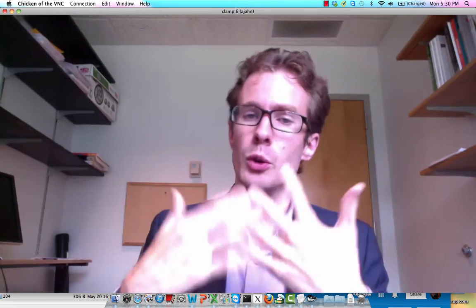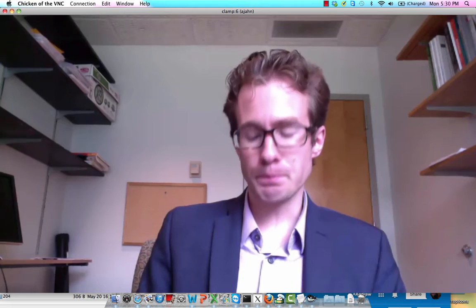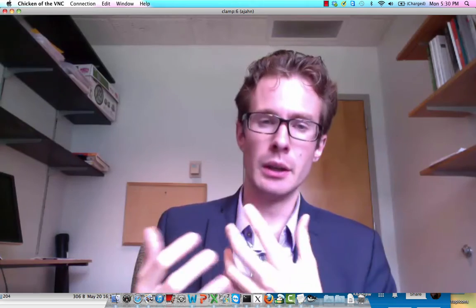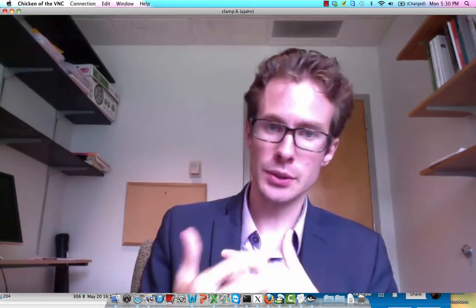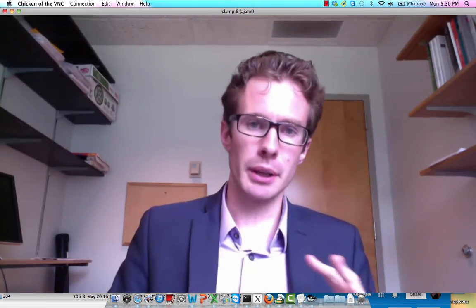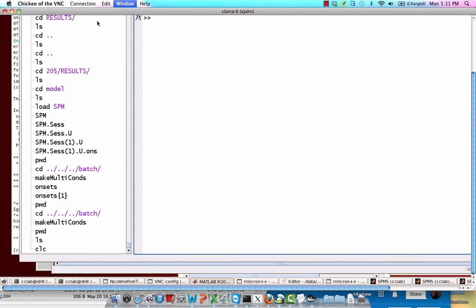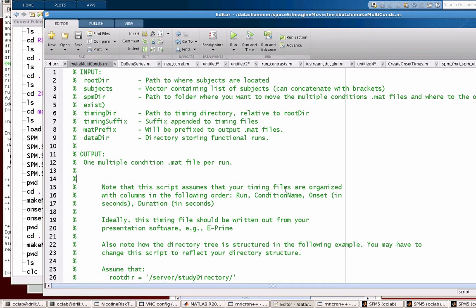I'll give a brief walkthrough about what it does, how it works, how you can modify it to suit your needs. But in my opinion, you do need to have some sort of command line to do something like a beta series analysis, where you can have potentially hundreds of occurrences of a regressor or condition, and it's just impractical to try to do that through the SPM interface. So let's show what this looks like right here in MATLAB. So here is briefly what the script looks like.